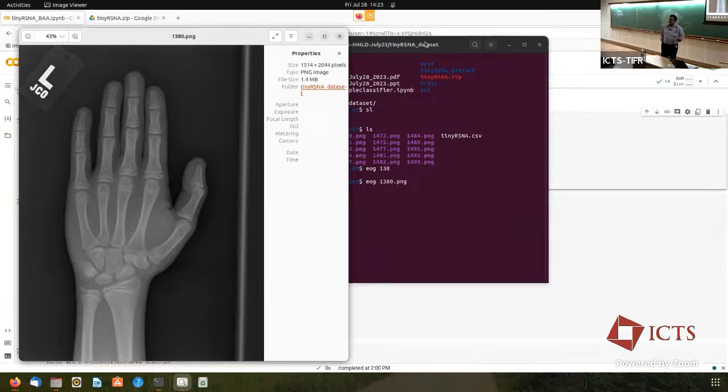They go by various names like stochastic gradient descent and so on. And you can play around with those. That's up to you. So batch size is going to be one of the hyperparameters, one of the tunable parameters in your model. Okay. All right. So this is how basically training is going to work for us.